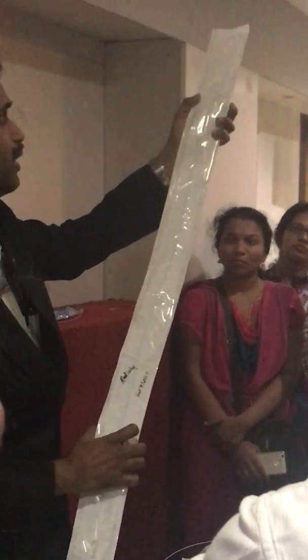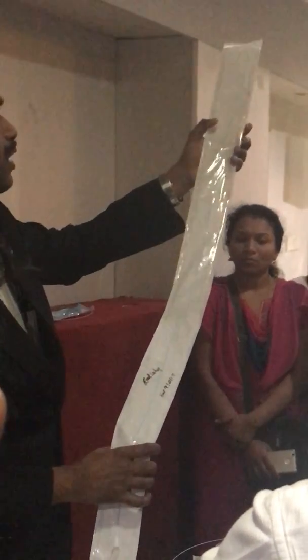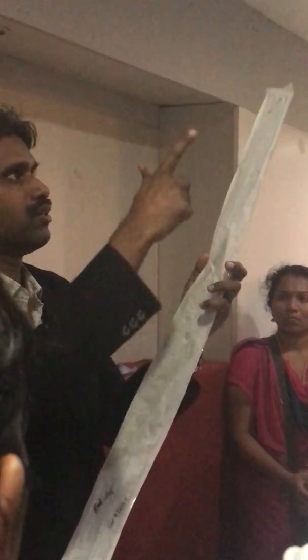And the catheters, this is the what? Sims. This is either the SIM catheter, or the Chuang, or something called the IMA catheter. All those will mimic each other like this. So even if you mistake one for another, it's generally okay. If you say SIM, it is okay. This is completely different from the Cobra or the head hunter.